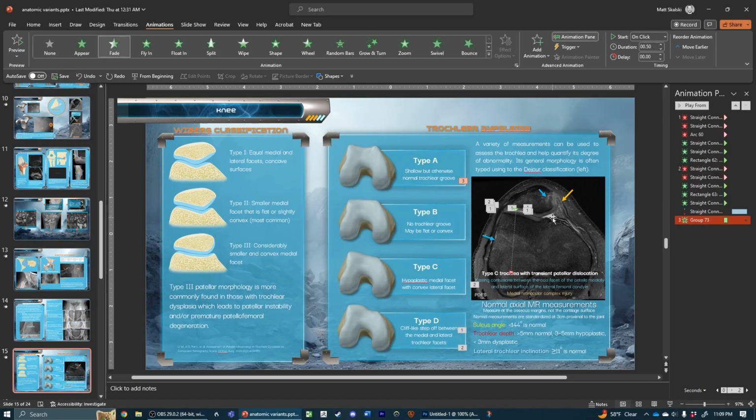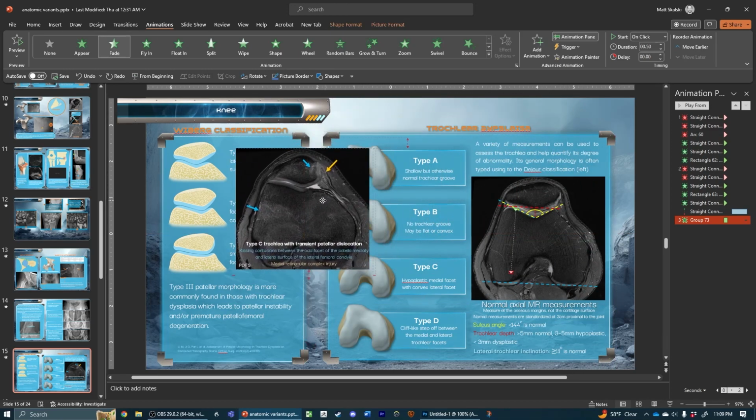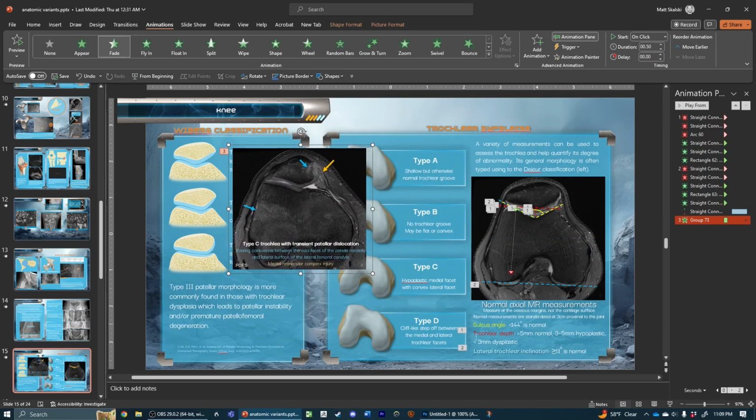Actually, maybe I should just show you me putting it in here. So I had done this single image here with all of this, and I think that one image just wasn't quite enough to capture it, which is why I made the animation. So let me go grab that.